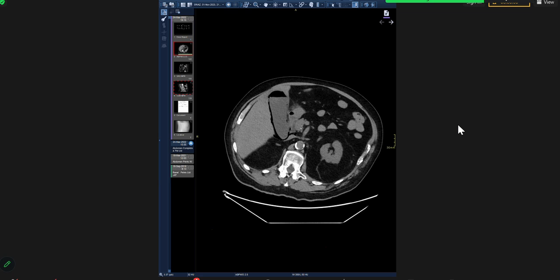So this is a case of, this is an emergency. When you saw the ultrasound, you have to immediately tell the physician, you think this is what I'm suspecting, because it is really dangerous. And then you say that if you think the patient is stable, we can proceed with the CT. And then, of course, you saw that we did the CT without contrast, and it has a very, very high mortality, very high.